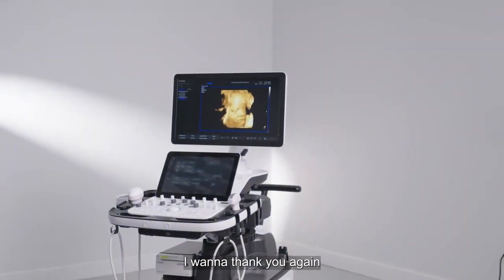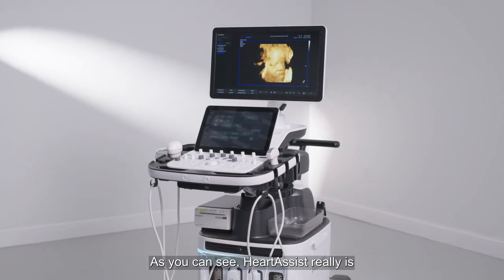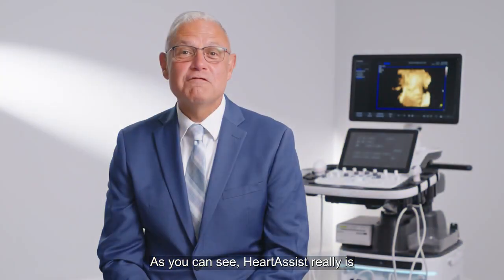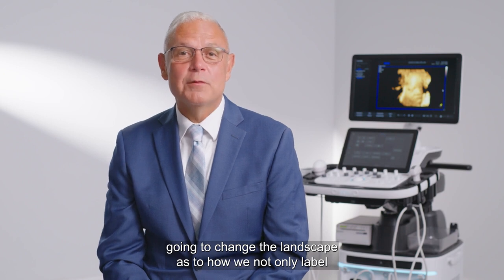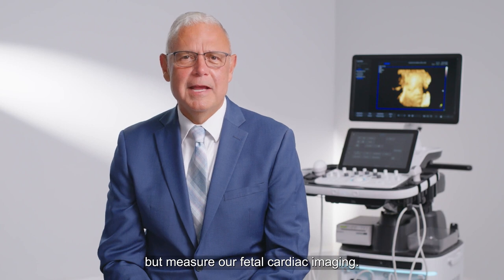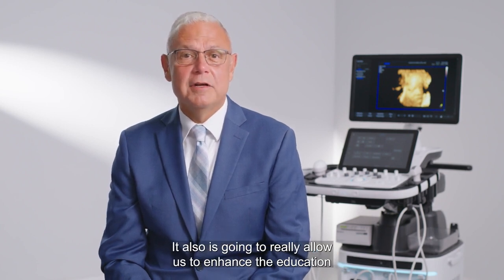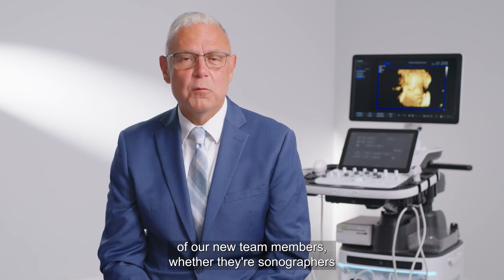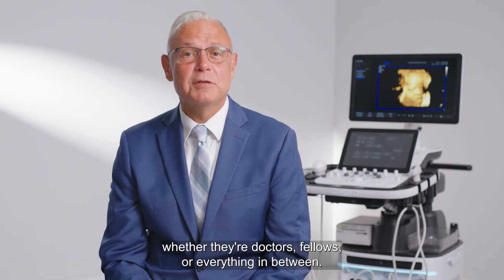I want to thank you again for investing time in hearing about our story. As you can see, HeartAssist really is going to change the landscape as to how we not only label but measure our fetal cardiac imaging. It also is going to really allow us to enhance the education of our new team members, whether they're sonographers, whether they're doctors, fellows, or everything in between.